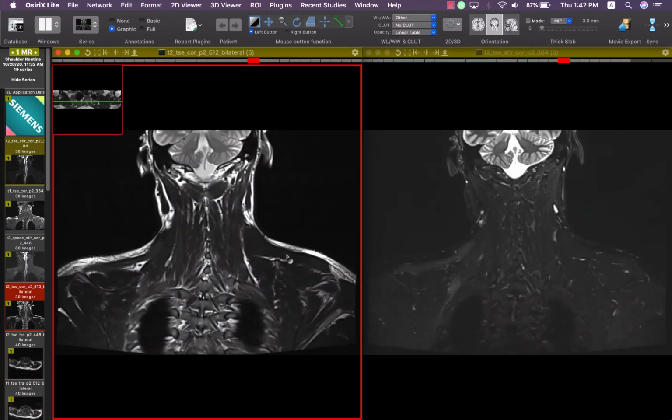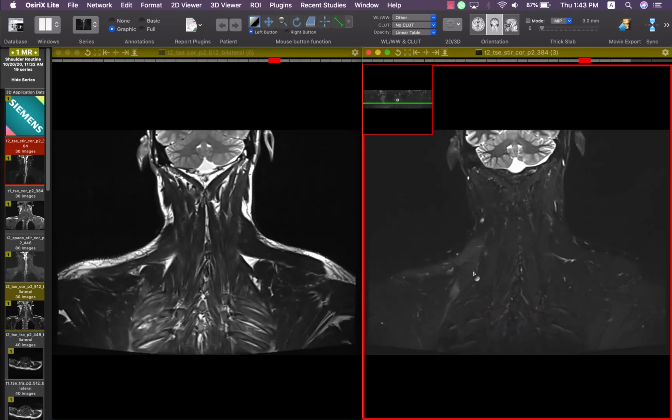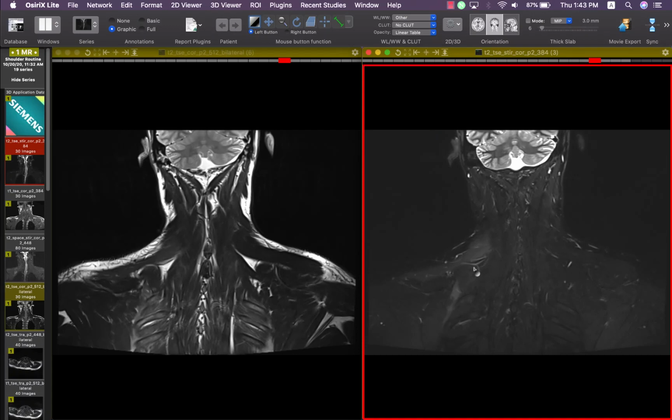In the acute stage, the bulk remains the same, but after that it starts to reduce in muscle thickness, and at the chronic stage it will be atrophied and there is fatty infiltration. The reason why the brachial plexus is intact while the trapezius is involved is because it is supplied by the spinal accessory. The spinal accessory is not a branch from the brachial plexus, it comes from the brain directly to supply the sternomastoid and the trapezius muscle.